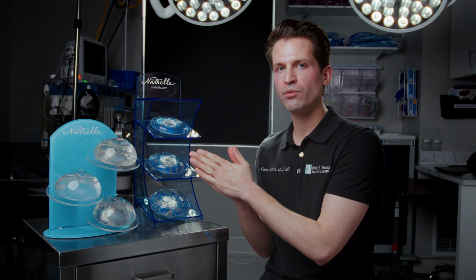Now, there are some inherent issues with those implants that make me not favor them, that I don't think is really worth going into in this video. In my summation, we can still get a really natural look for you with a round implant going under the muscle that is chosen for your size, shape, and desires. So honestly, I don't even really do those teardrop shape implants because we can get the look you're going for with the smooth round implants.